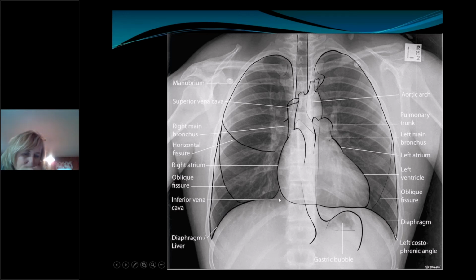The diaphragm, again, on the right being much higher than it is on the left because of that liver. Identifying that there are things called gastric bubbles, that those aren't super tumors hiding or things like that. So some of these things are important to at least understand. And granted, each patient's a little different. Their body habitus is different. So it may not always be quite as easy as what we're seeing here.